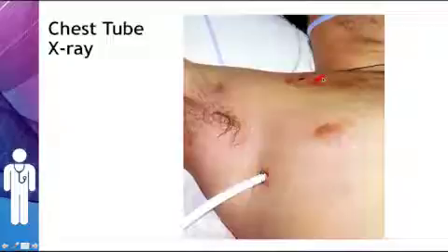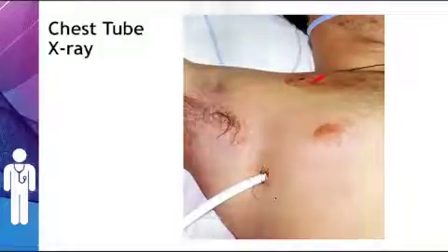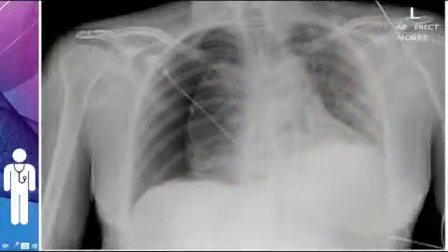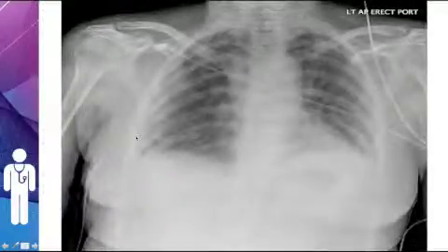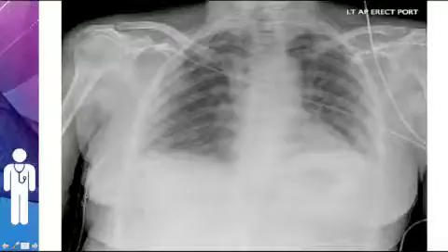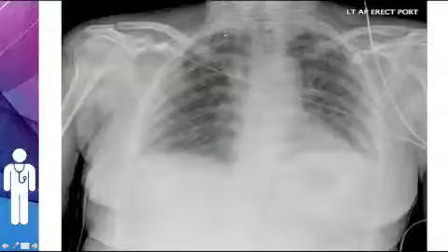and this patient has had a decompression of a tension pneumothorax. This chest tube looks in a good position at the line of the nipple and the mid-axillary line. The patient may have had something like this, a large pneumothorax, and after the chest tube is placed, you need to check that the tube goes through. It doesn't lie in the soft tissues, it goes all the way into the pleural space and sits nicely in that space there. Can't go wrong.